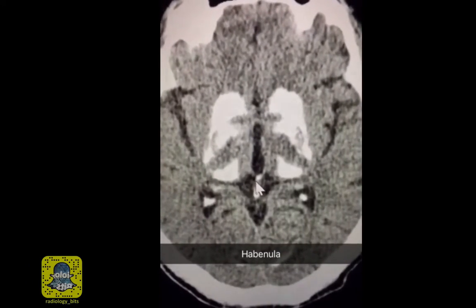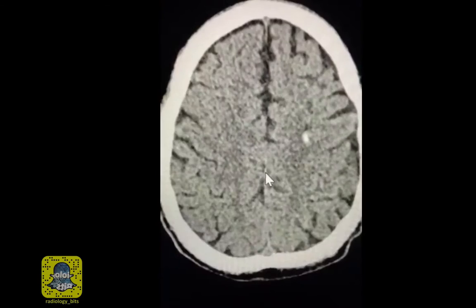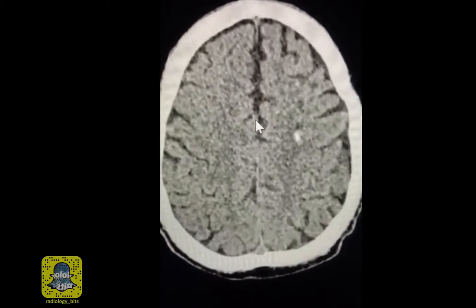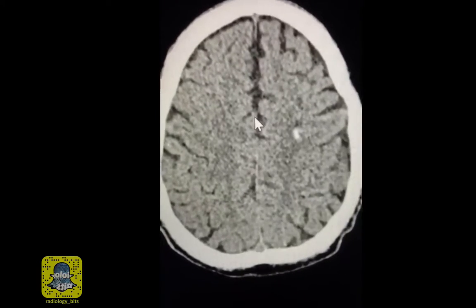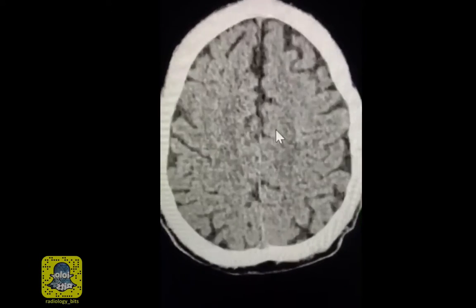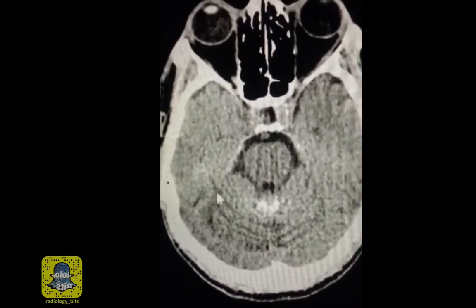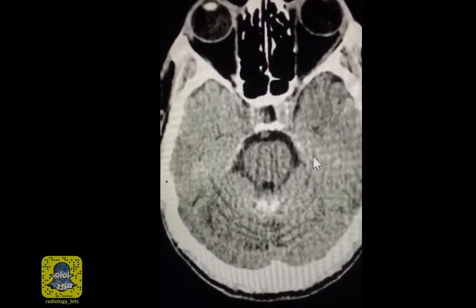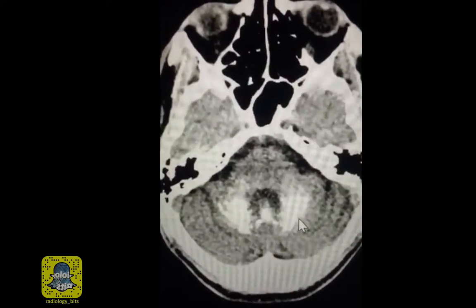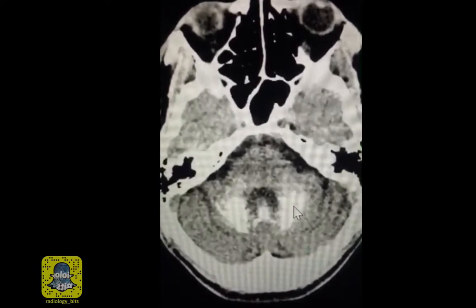And the collection of neurons in front of the pineal gland is called habenula. This could also calcify as well. Another location for normal aging calcification would be the meninges and what's arising from it. By that I mean the dura covering the brain could have some calcifications that are scattered. The same could happen within the falx cerebri and the tentorium cerebelli, structures that we talked about in a different case last week. You may even see a minor degree of calcifications within the dentate nuclei of the cerebellum, of course not as extensive as this.